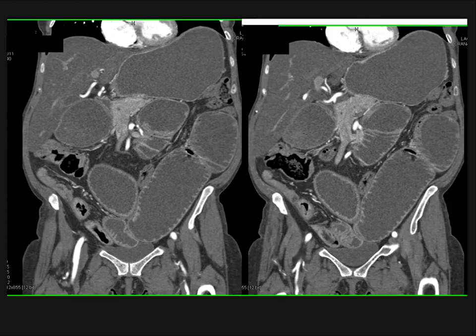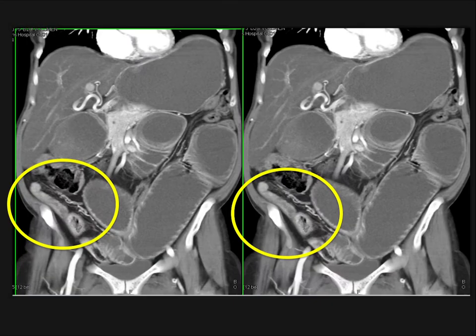And then you ask the question, well, what's going on here? Well, could this be a tumor? There's an increased incidence of cancer in Crohn's patients. This could very well be a tumor. There's narrowing, enhancement, and we worried about a tumor because we've seen a number of cases of that. This patient had surgery because of the obstruction. This was simply inflammatory. At surgery, it was palpable, but it was simply inflammatory.